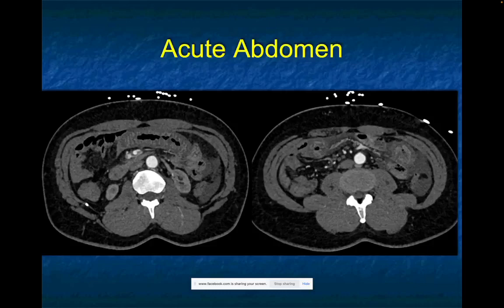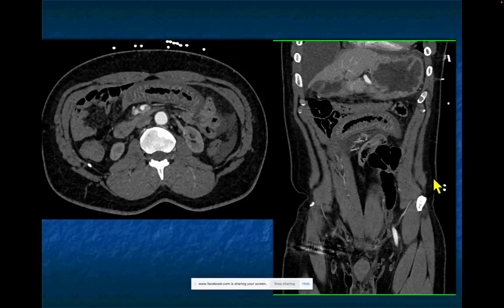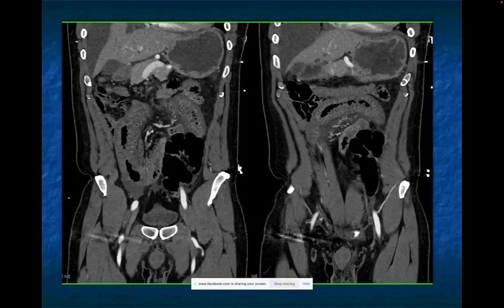Okay, what else? Acute abdomen. Look how ugly, I hate to use the word ugly, but look how ugly that small bowel is. Markedly thickened, edematous, ascites, long loops of bowel. This bowel looks really inflamed. It looks like a very, very aggressive acute process. I'd be thinking about bowel ischemia. I want to look at the mesenteric vessels, make sure they're good.